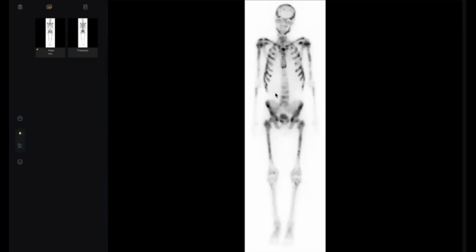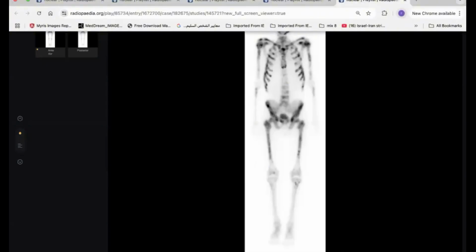Not yellow, red bone marrow. Why does the metastasis go to the red bone marrow? Because it is highly vascular. And the proximal part of the limbs still has red bone marrow. That is why it is in the axial and the proximal skeleton.